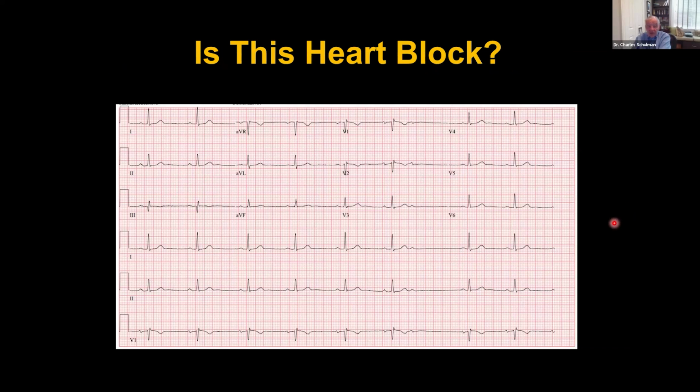Okay, so here we have another one, and let's look at this. Okay, sinus rhythm. It's sinus bradycardia, but sinus rhythm. And then a pause. What's the cause of the pause? Can you see it? Right there.